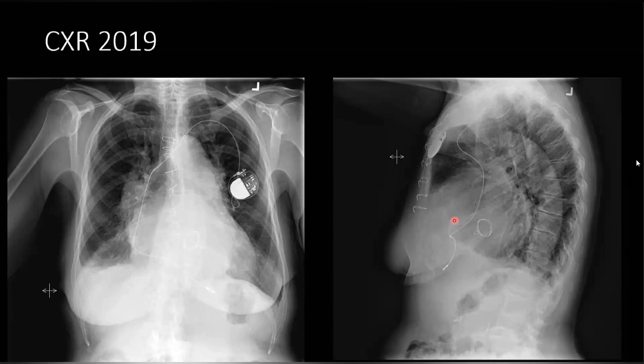Okay. So this is arising from the neck and extending inferiorly. What is the location? It is pointing towards the IVC, I think. Okay, that's very good. It's towards the IVC. It's a tricuspid annuloplasty ring.